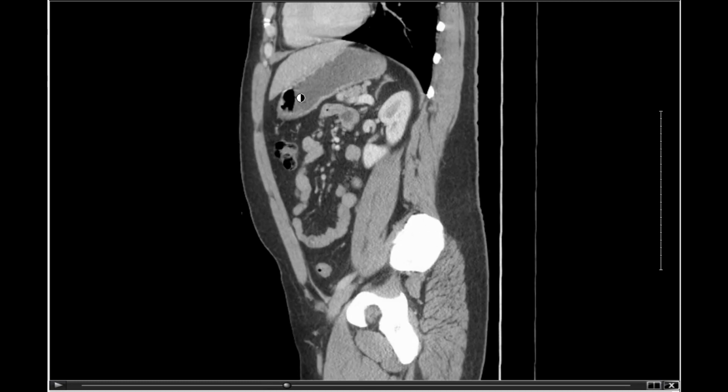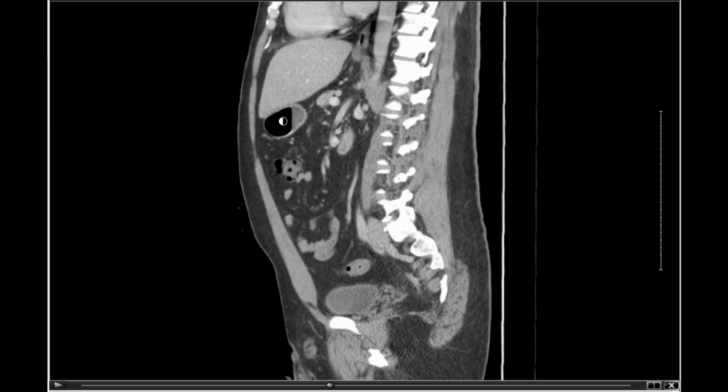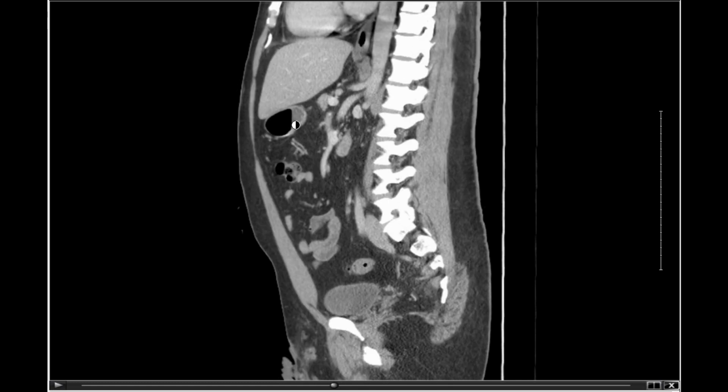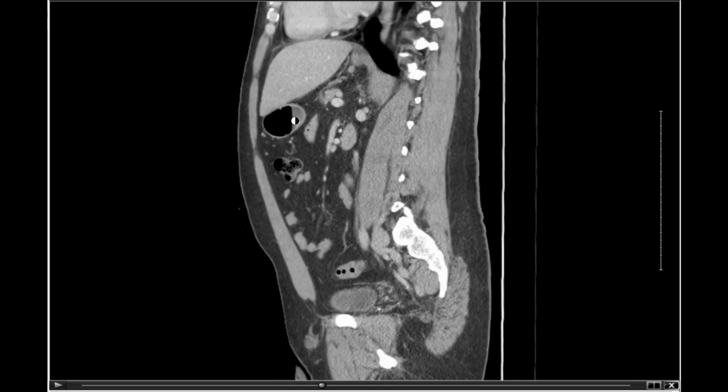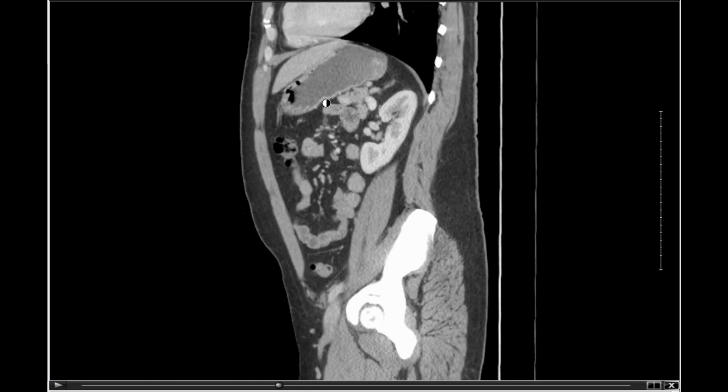As we go a little further interior, right there, big bunch of gas just before we hit my pyloric region. Right there, the pyloric sphincter is going to be thickening just there. And I was in the hospital getting the CT scan for severe abdominal pain, so the fact that there's some gas in there should not come as a huge shock.